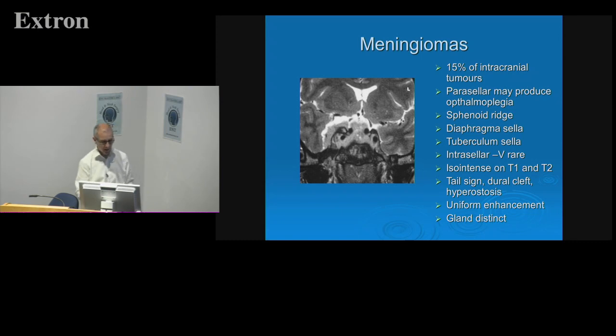So obviously, in this case, you can see all the tumour outside of the cavernous sinus. Interestingly, you can see these are the nerve roots and that being displaced away from that lateral wall. This is where they are on the opposite side, so you can just see the anatomy of the cavernous sinus there very nicely. And that's tumour that's invaded from outside within, I think, rather than being from cavernous sinus going out. Fine, and those are all the different features that we've already mentioned already.